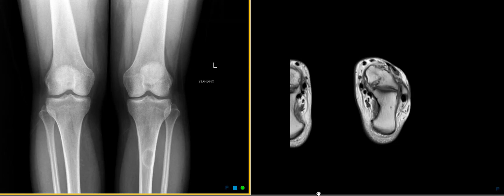This is a 29-year-old female who has left knee pain for about 3 years. They did an x-ray and noticed that there was a lytic bone lesion down here. This is the left tibia, the upper diaphysis, or the upper shaft. We see a lesion with sclerotic margins and lucency centrally. It looks well defined, and the pain was a little bit below the knee, so they got the patient back and did an MRI to evaluate this.